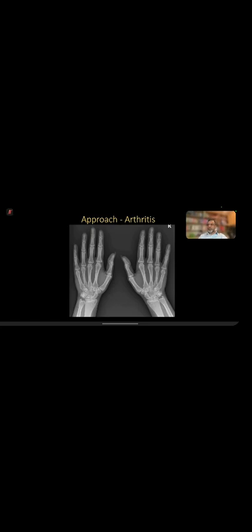So we're looking at the X-ray. Patient presented with morning stiffness and pain in the hands. How would you work this out? You go to the X-ray, you're reporting it. What do you start looking for? Very good. Absolutely. You're looking for the distribution, if there's any abnormality, bone density, any joint space narrowing, any erosions? Yeah, all these things. Very good.